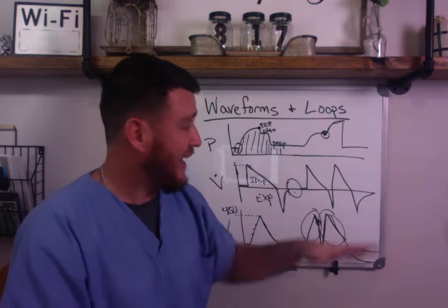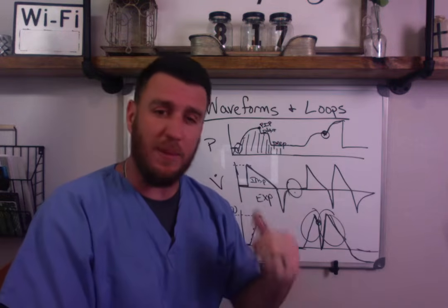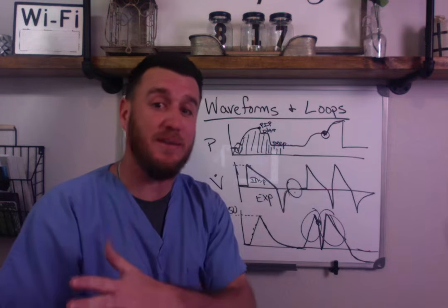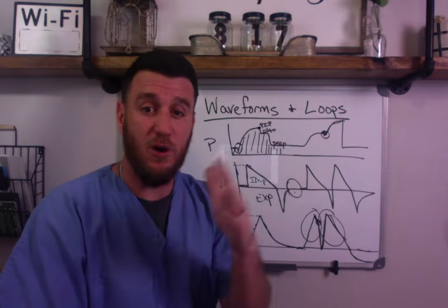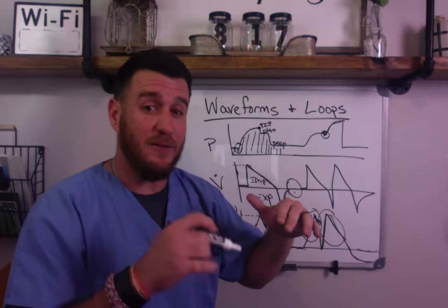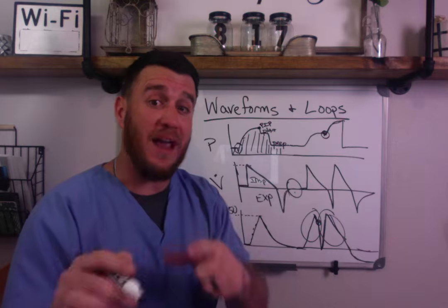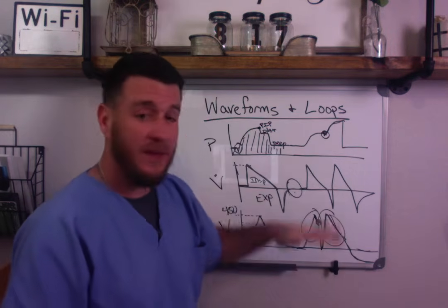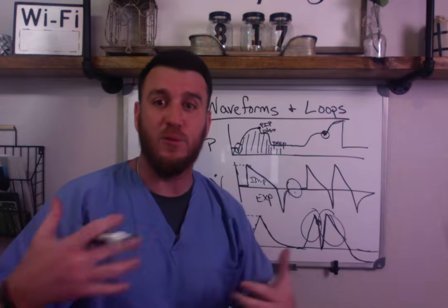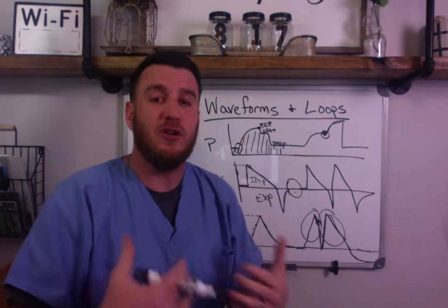Ask yourself, can I stop this if I just increase my tidal volume just a little bit? You're probably stuck on 6 mLs per kilo. But remember, we can go up to 8 mLs per kilo. So 450 may not be, if that's 6 mLs per kilo, if let's just say 480 was 7 mLs per kilo, and at 480 you eliminated this, then guess what? You've satisfied your patient's drive to breathe for what they're asking for and what they want. Your patient wants a little larger tidal volume.